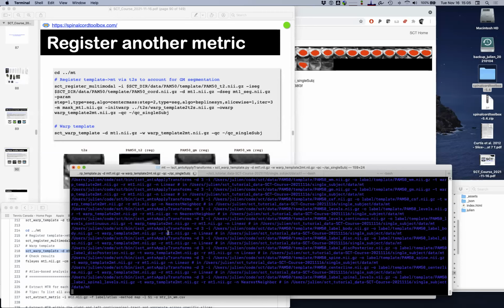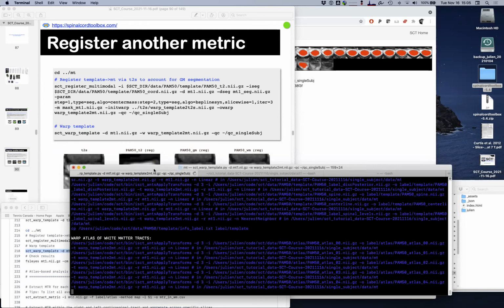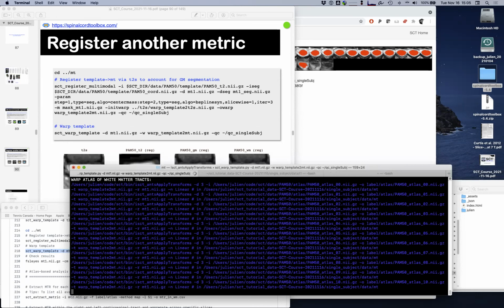Any question? I know these last steps might have been a bit confusing for some of you. One question in the chat from Catherine: if you have bad data, would it be obvious by this step? At what stage do you typically weed out bad scans?